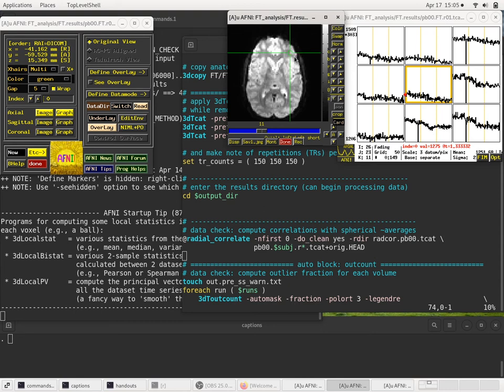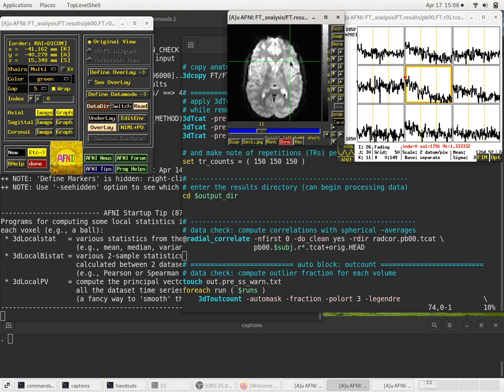If the motion takes you from one tissue type to another, you'll have a big signal change, or percent signal change, say. If you're within a tissue class, like gray to gray, or white to white, or CSF to CSF, there might not be a big change. Like in this voxel, we're probably in the middle of white matter here. Not a big spike.